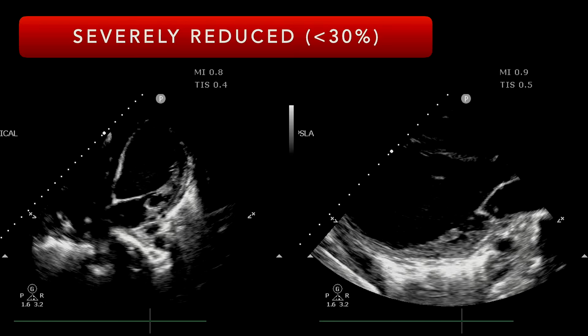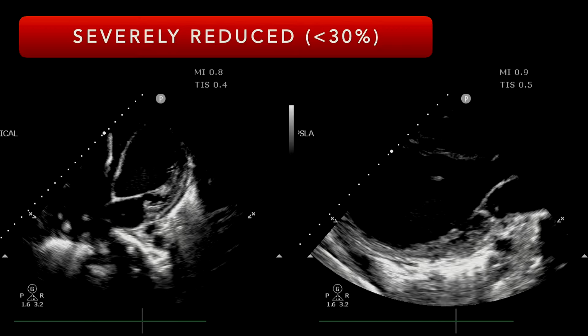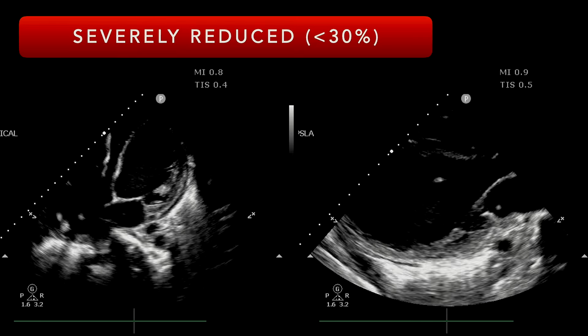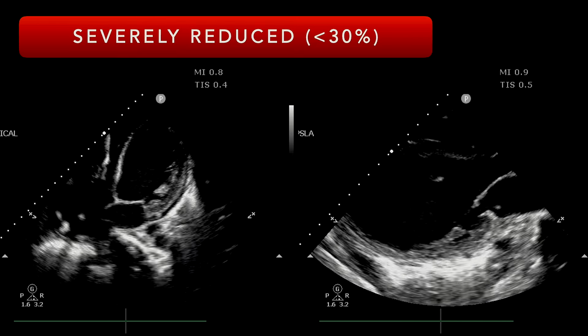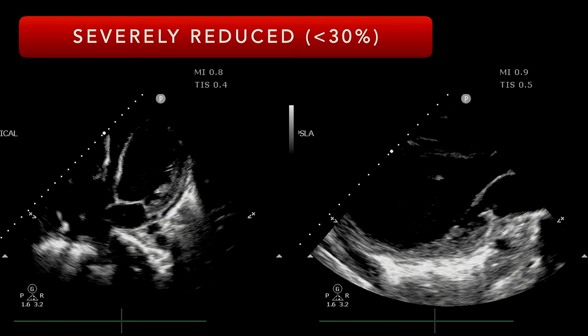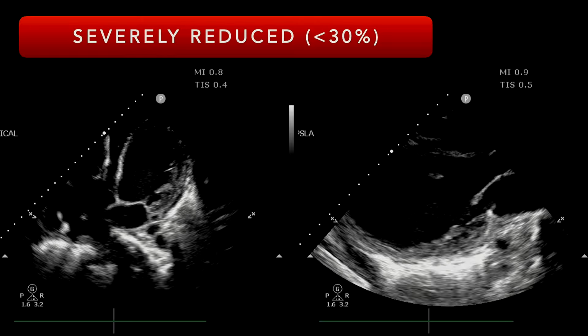In fact, one of the things we notice here is that the left ventricle is pretty profoundly enlarged, right? And this tells me essentially that this patient has had a very, very high left ventricular pressure for quite some time that has resulted in some remodeling and some dilation here. And that pressure is largely probably due to the fact that the patient has had a pretty low ejection fraction for a decent amount of time.